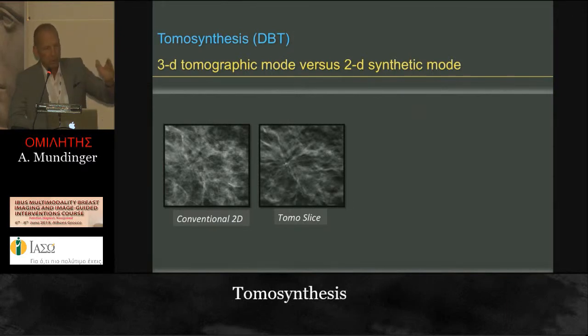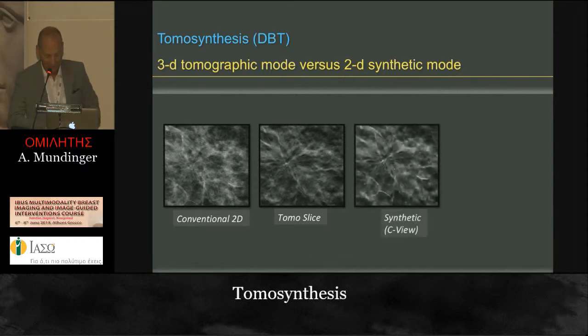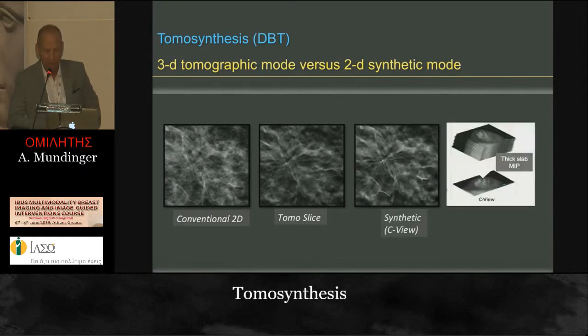What are synthetic images? We don't use only these very thin tomographic images, we also use thicker slices. And if you make a thick slice, a reconstructed slice of the whole breast based on the very thin images, this is just a synthetic 2D mammography.